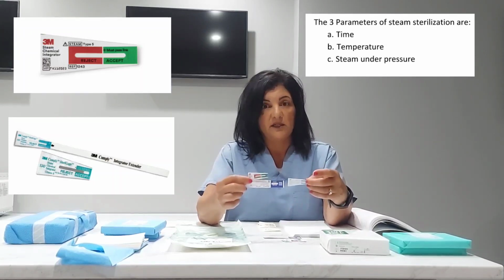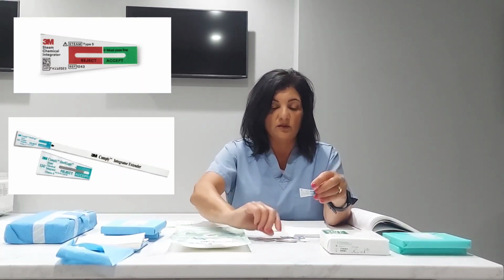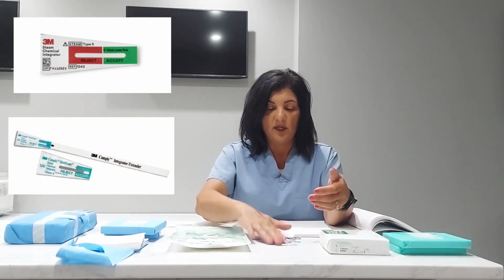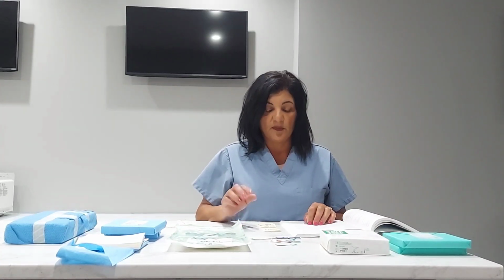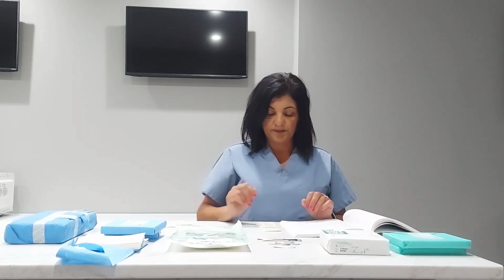So these are reacting to all 3 parameters. And again, whatever your facility uses, these are just some examples that I had to show you. So those are equal to or exceed the requirements for a biological. So these are pretty much the industry standard as your type 5s.